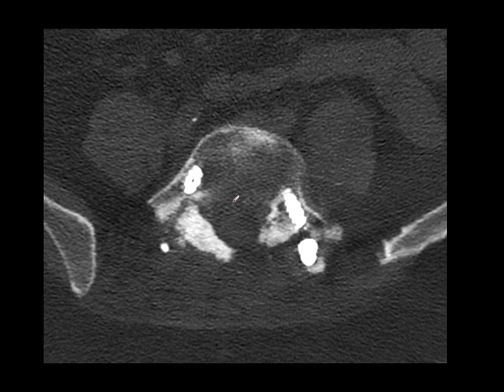And the way we can approach bone scintigraphy is to use our planar images to guide us to the target and then perform a SPECT CT of that area. If we know in advance that a particular area is going to be questioned, for example, in this case the lumbar spine, then we can prescribe a SPECT CT in advance so the technologists and radiographers can just get on with it without having to discuss it with us further, and we can plan the list that way.